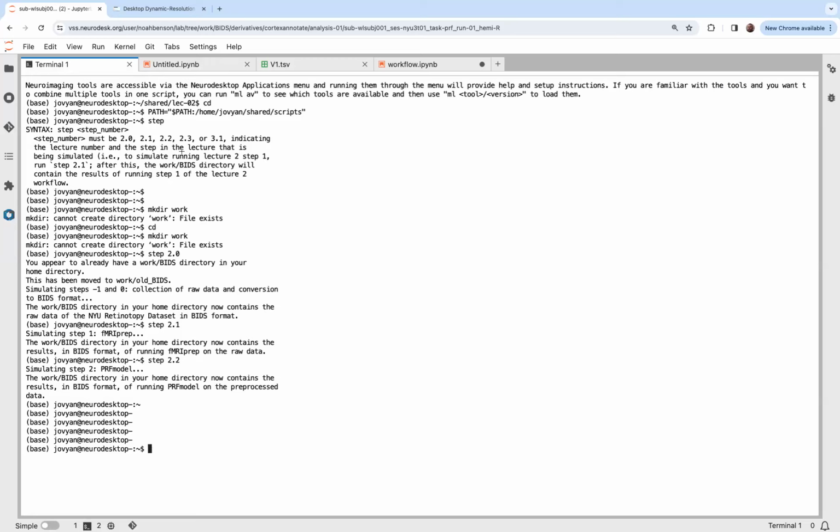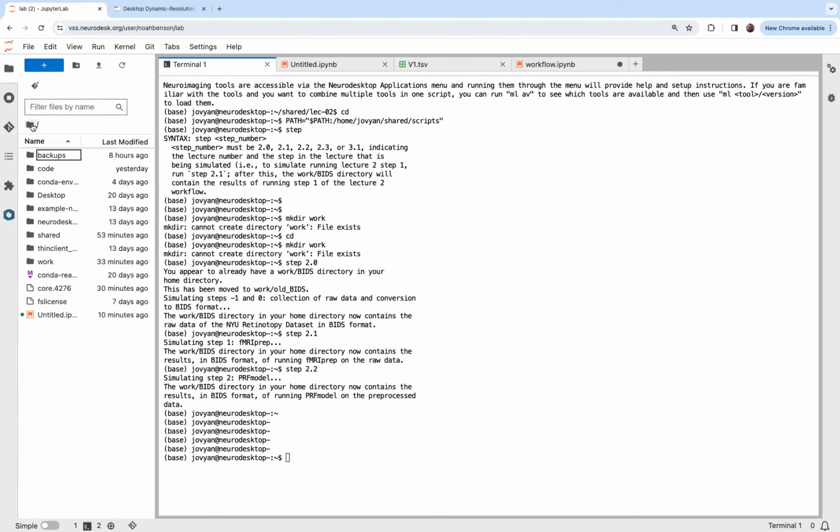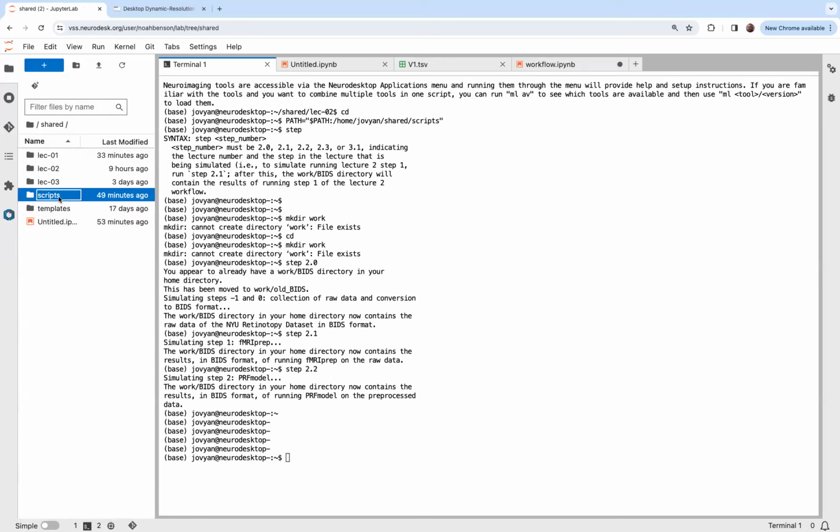Okay, so if you guys navigate, sorry guys, so if you guys go back to your home directory and then shares, lecture 3, ESS 2024, this will be our actual repository where all the material will be available.